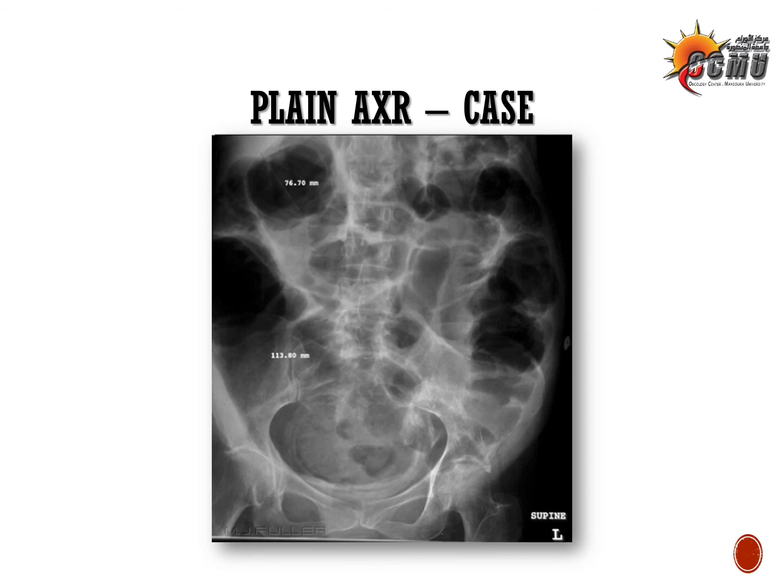So the transverse colon is dilated and the diameter there is more than 6, about 7.6 or so, as well as the cecum, which is also dilated beyond 9 centimeters. So both segments are dilated, which denotes more distal obstruction with this proximal dilatation.